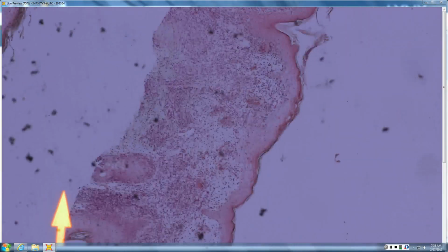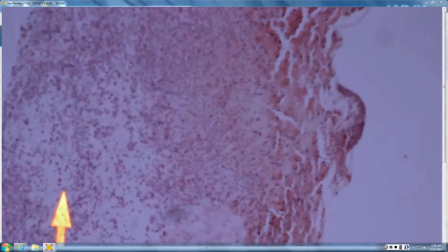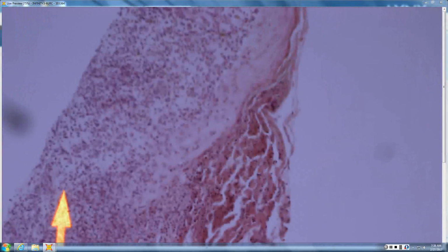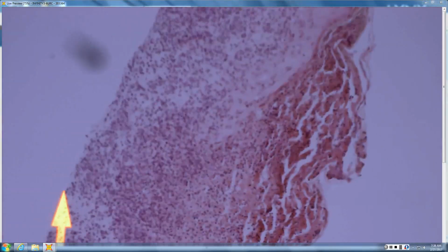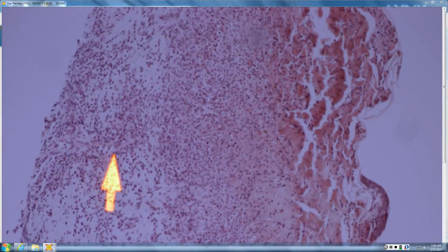Okay, so we have a lot of edema, a lot of inflammation, and then, Dan, what do you see here? There's an ulcer and some neutrophil debris. I'd like to take a look at the endothelium since we're in the viral chapter. So, make sure we don't have any CMV. Endothelium, you would look for cytomegalovirus change. Tell me about the dead epidermis.